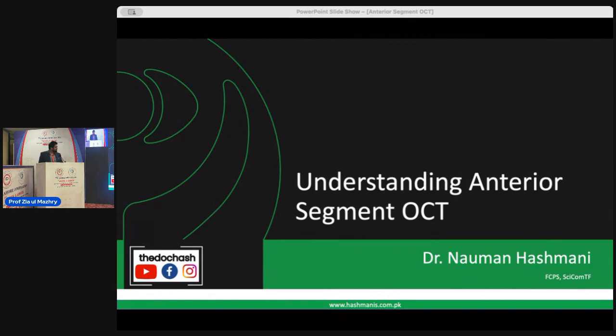My talk today is on anterior segment OCT. We all see posterior segment OCT quite often in our clinics, but I have seen very few presentations on anterior segment OCT and how to interpret it. So let's go through it.